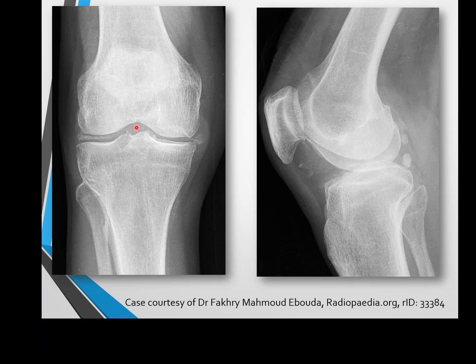In this particular patient, there's very little evidence of any joint degenerative disease in particular. You could argue that there's a little bone spur occurring on the medial aspect of the tibial plateau, but otherwise this looks like quite a healthy looking joint, other than the calcium build-up within the joint tissue itself.